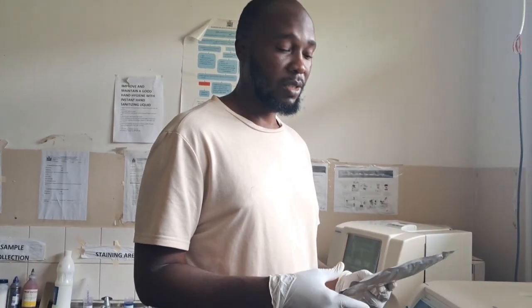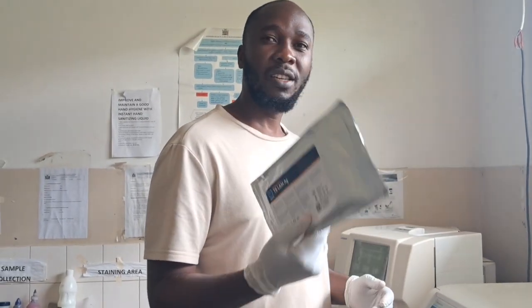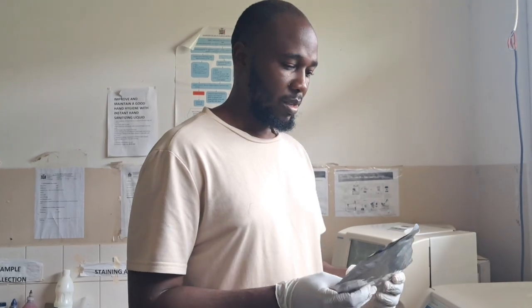It's called POC. It can be done at any department. Anyone can do it. It doesn't need the lab personnel. A clinician, a nurse can do this one. So this is LAM, urine LAM. I'm sure most of you have heard about it. So urine LAM is an RDT, rapid diagnostic test.